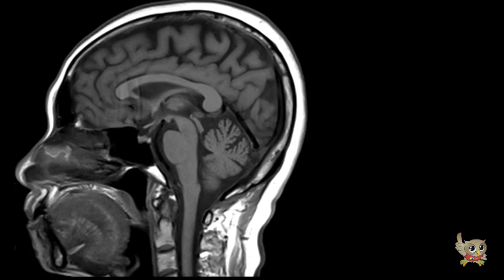In the subarachnoid space, there are prominent spaces called cisterns. Cisterns are spaces within the subarachnoid space where the pia mater and arachnoid membrane are not in close approximation. In front of the midbrain, there is the interpeduncular cistern. Posteriorly, there is the quadrigeminal cistern, which is posterior to the quadrigeminal plate.